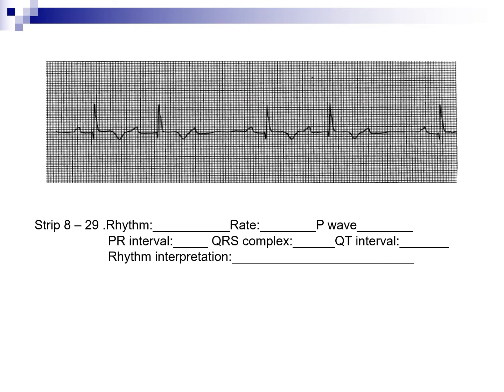In 829, this rhythm is irregular. The heart rate, we will do the 6-second strip, so we will say it is 50. There are P waves. If you look closely, they look pretty much the same, they are the same distance apart. It looks like you have more P waves than QRS's, so we are in a higher grade block. So we have sinus P waves.